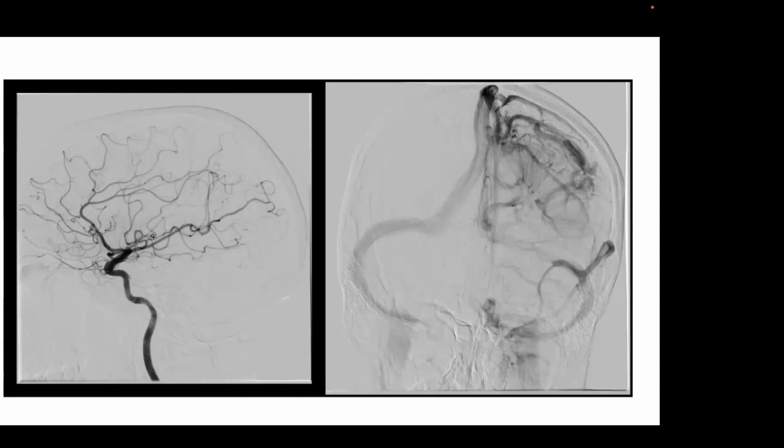And I think there's no harm done in doing an angiogram in a case like this, just because it is so unusual. But I think at the same time, it's important that we entertain the correct diagnosis as we go into it. So here you see the caput medusae draining into this particular large vein, but there are many other vascular channels. So kind of an odd appearance of a DVA.